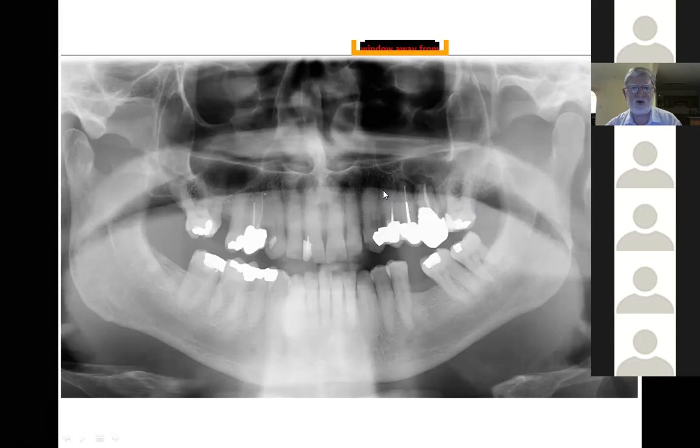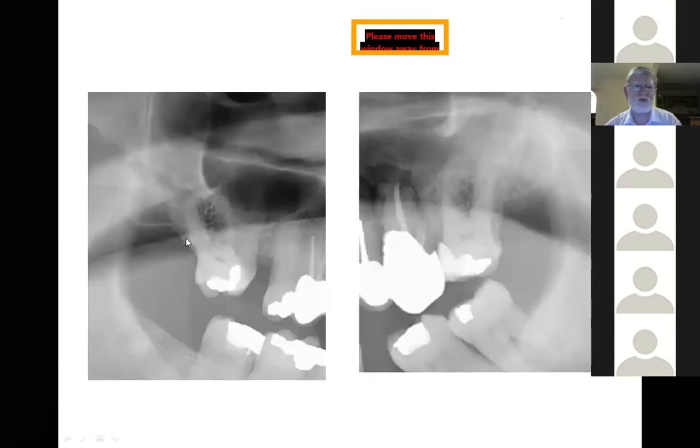So let's go to the next picture, and you can see 4 roots. So there's one root there, there's another root there, another root there, another big root there. The same here, you're looking at 1, 2, 3, 4 roots. But what struck me was how massive, how divergent everything was there. The tooth looks tiny in the mouth. It's a monster up in the bone.